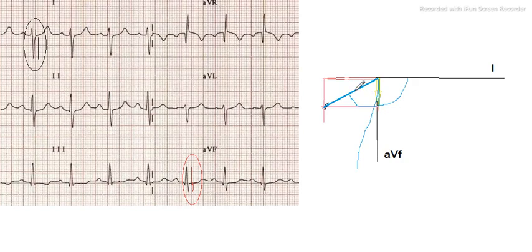For differential diagnosis, you can put right ventricular hypertrophy, or it could be because of right bundle branch block. So in this way you can find the axis, and you can determine the axis from a given ECG.